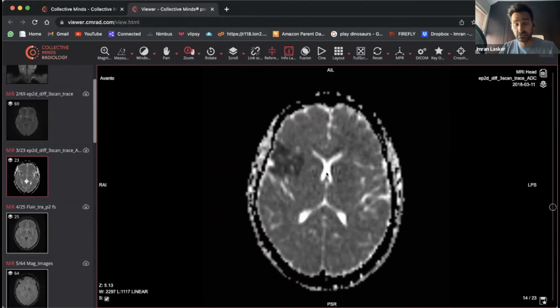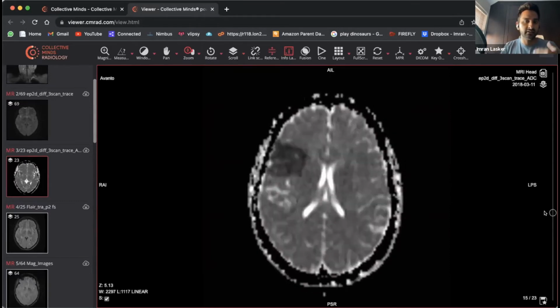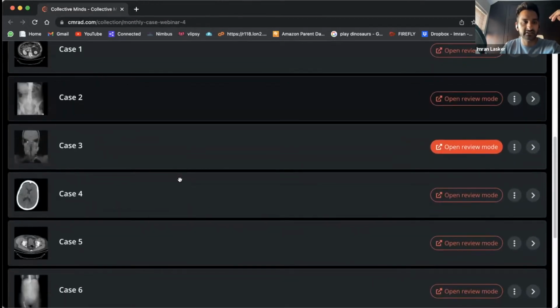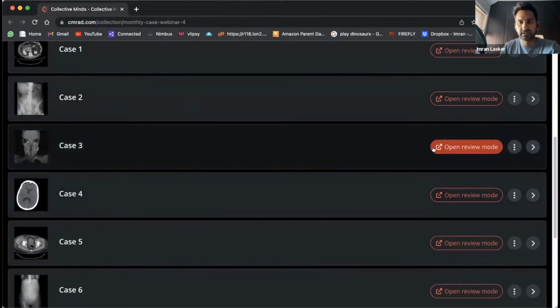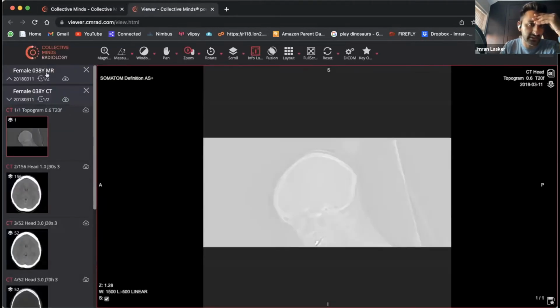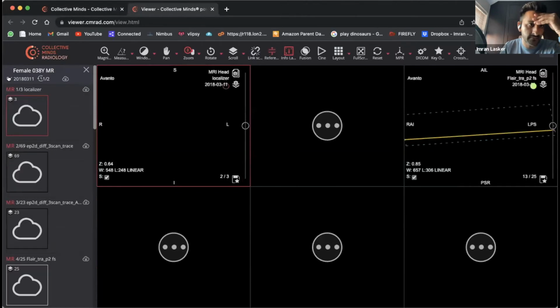And in this particular image, we've actually got the MRI scan to prove what we saw. And I think with this particular patient, they had continued weakness. They had really strong clinical suspicion. They thrombolysed, and then they also did an MRI scan to try and characterize it more, and that's what they found.